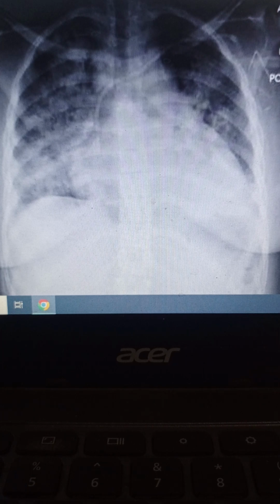Right. I am Dr. Abbas, and today we are going to discuss another pulmonary case in medicine. We are going to discuss a chest X-ray related to a very classic finding of a pulmonology disease. Basically, it is a complication of a disease. I give you 5 seconds to spot the abnormality in this X-ray. After this, we will discuss the scenario.